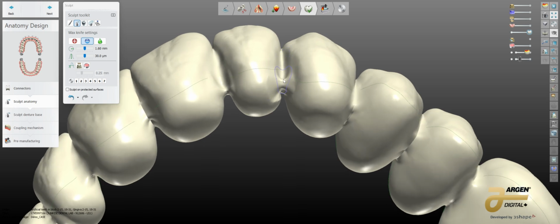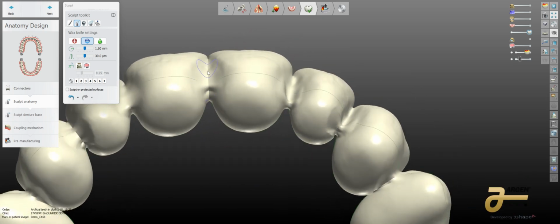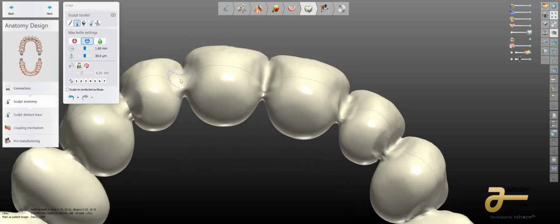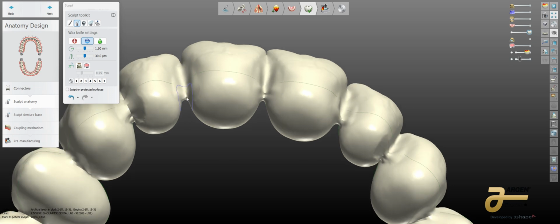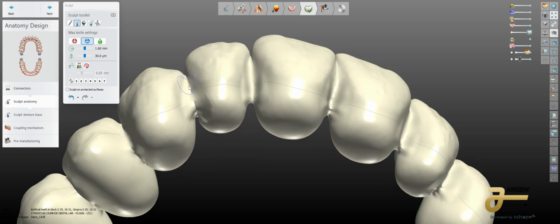Try not to deviate left or right. Same thing. Lay that circle like this and come straight back through. And just do that for the six anteriors, where the aesthetic zone matters the most. All right, we're going to come back through this last joint here, and I think I got one over here on the opposite side.